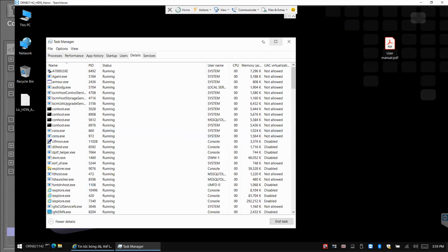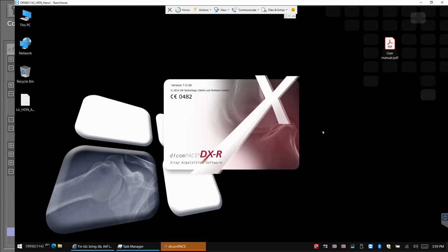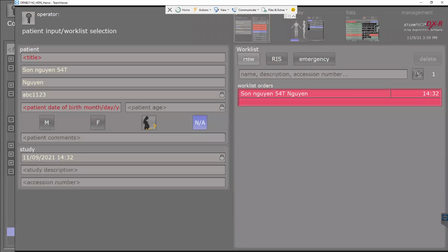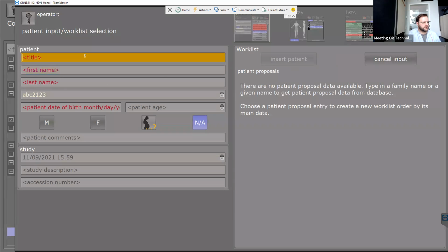I think this is useful for the doctor because they want the patient ID to generate automatically following desired characters. You see, ABC one, but it's 1, 2, 3. Let's make it.